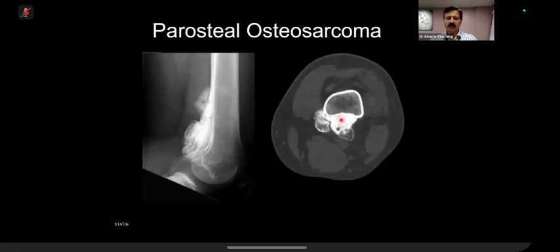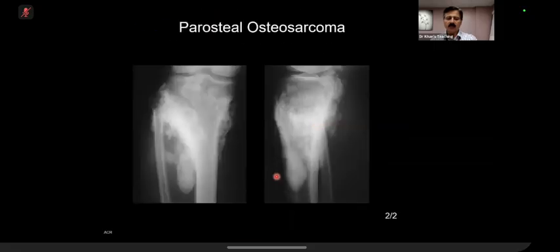And in the case which I showed you, what is happening is that there is so much ossification that it has gone all the way around. And if you come back here, you can see that it has gone all the way around. It's quite a unique type of appearance. As I told you, it's an Aunt Minnie case. If you have seen it, you are not going to miss it. If you have not seen it, you will be struggling.